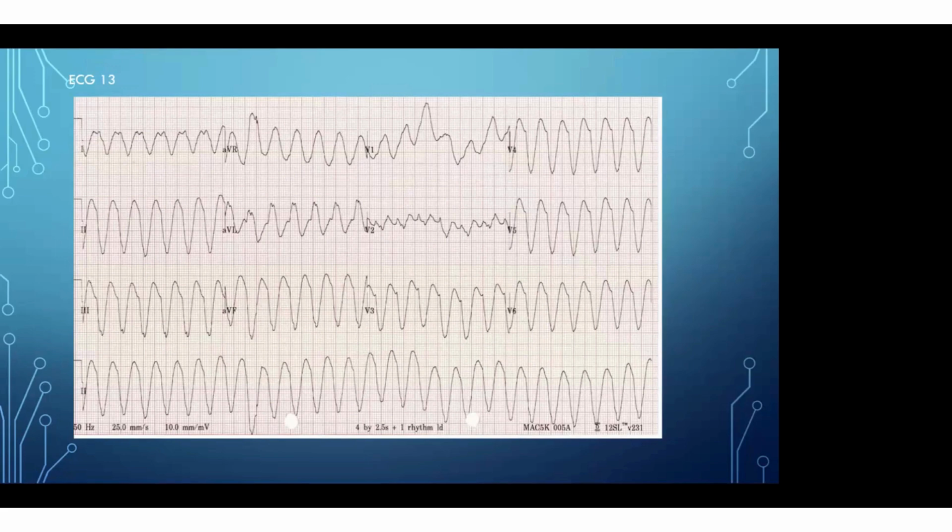But in a patient with VT arising from the apex or the base, that transition will be lost. So V1 to V6 will have either only positive or only negative waves. In apical VT, we will see all negative waves from V1 to V6. If you see a concordance pattern in V1 to V6, that is more likely VT.